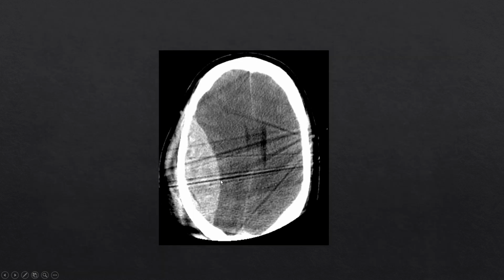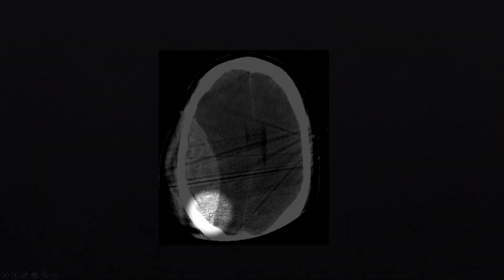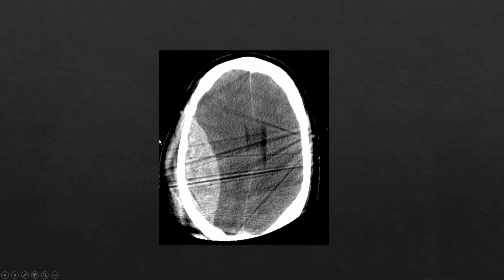Our first case, we have an epidural hemorrhage. Notice its biconvex lens shape. And this will occur on the side of the injury, usually, the coup injury. These rarely cross sutures because the dura is attached to the sutures. 90% of these are caused by arterial injury and most commonly going to be caused by the middle meningeal artery. 10% of these epidural hemorrhages are actually dural venous sinus injuries. They're usually unilateral and again found adjacent to the site of impact where you're going to find skull fractures.